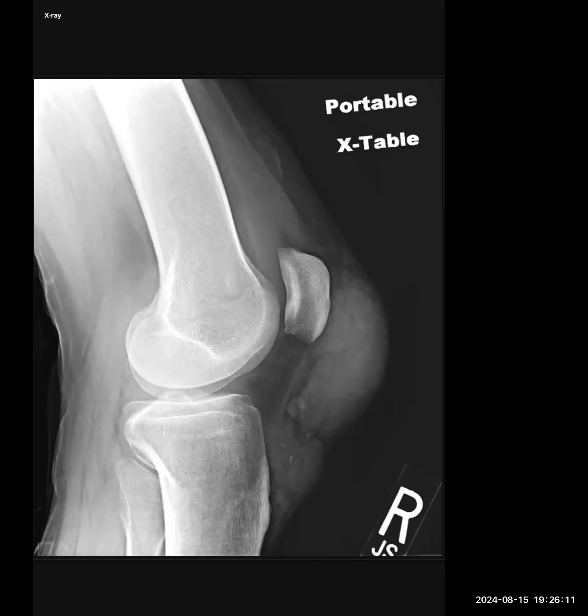Basically there is a prepatellar swelling in the anterior soft tissues of the knee joint with some calcific densities. I think this could be a bursitis or a crystal deposition disease because of the calcific deposits. So I'll do an ultrasound guided drainage of this and send it for analysis. Yes, sir. I will inform this case to the referring doctor as well for further management.